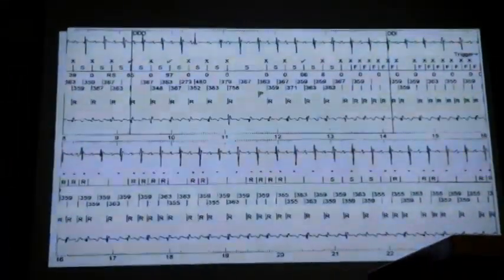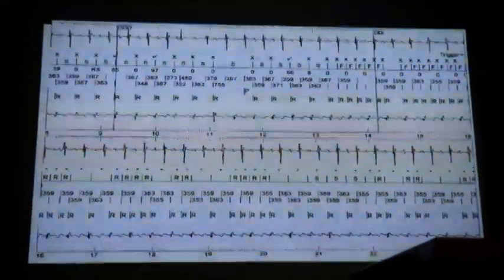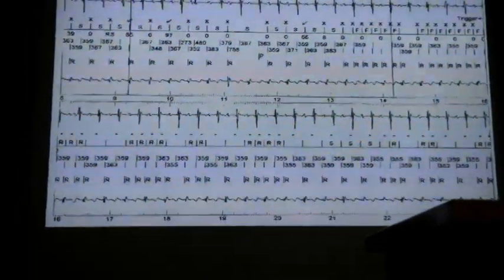So what do you do? I mean, you could go in and reposition that lead. No, exactly. This is an 18-year-old, you know. So we decided in this patient to just go up with the VT detection. Well, if you look at that RR interval there, it is about 200 milliseconds. Yeah, he's young. So we can't go so. But this is 359 milliseconds.